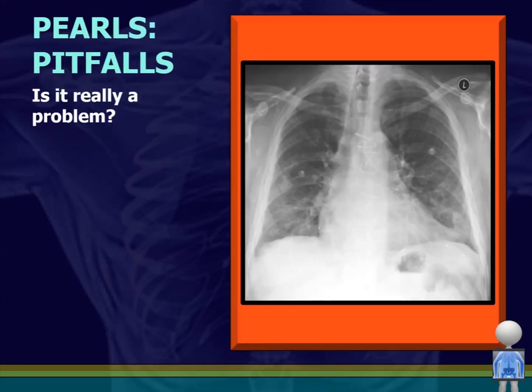Some pitfalls I just want to share with you that happen to a lot of people. We're looking at this film, and there is an underlying pathology, and let's just look past that today right now because you're not there yet.